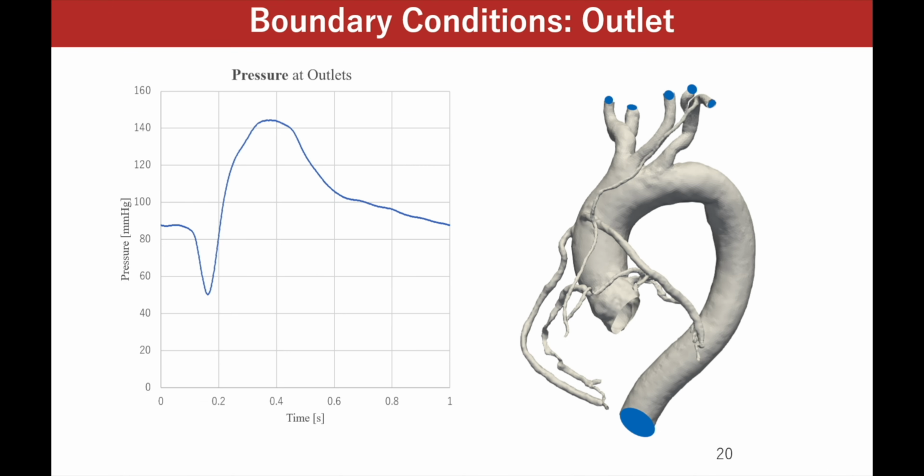The outlet boundary condition is shown here, along with a graph depicting pressure through the highlighted spaces at a point in time. As the flow rate increases, the pressure in these areas will also increase. The pressure at the outlet is set to simulate heartbeat.